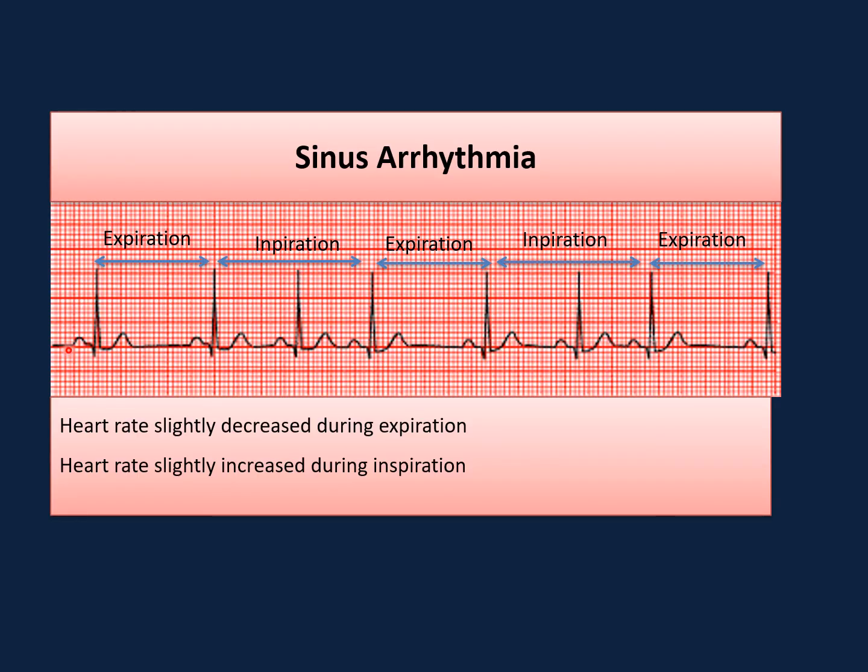Here, this is a case of sinus arrhythmia, PQRST, and here slower then faster, slower then faster. This is during expiration, inspiration, expiration, inspiration. This is normal, requires reassurance.